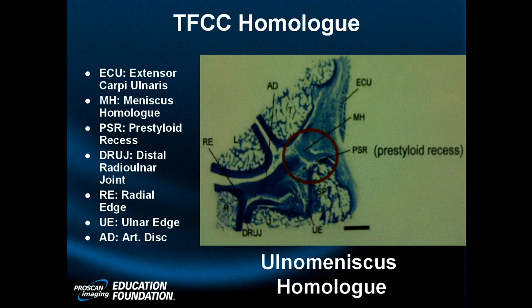If you don't know what the signal of hyaline cartilage is today, my advice to you is to go home and start drinking heavily. So we've got cartilage on the ulna. We've got cartilage on the lunate. And all of these structures come into play in ulno-lunate abutment syndrome. Now, things get a little bit complex out here. The TFC does a deep dive.